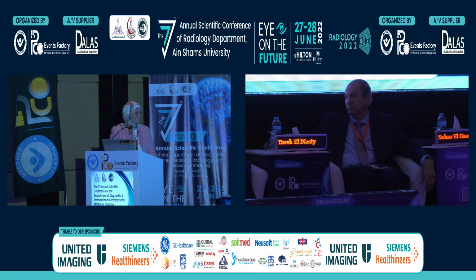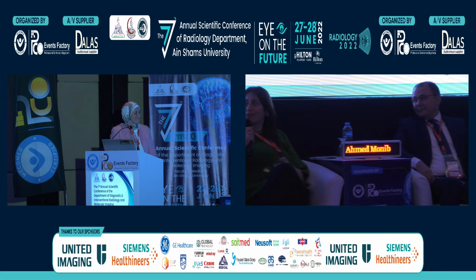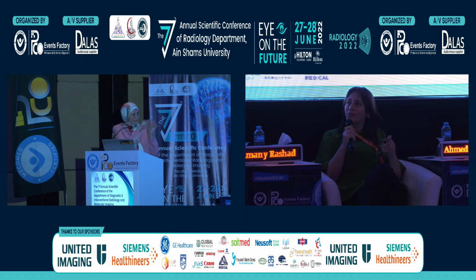Okay. Just a quick question: what is the relation with the inchworm appearance they describe? You know what the inchworm is, the worm with its curved way of walking, curved with nothing in the middle? This is how it appears in the diffusion weighted image. Yes, this is a classic appearance for non-muscle invasive disease, no muscle invasion. Exactly. Okay, thank you very much.